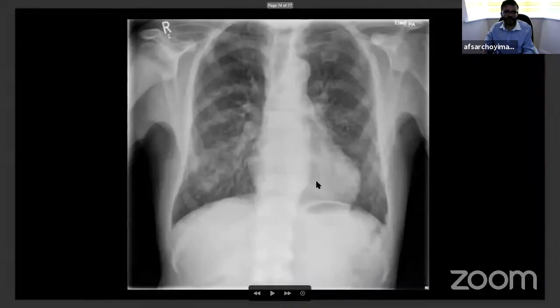So this is the last X-ray, or last 2 X-rays, and you got this patient with the fever, cough, and you got interstitial thickening there. You can see additional lines. And the key thing in this X-ray, you got the answer of what you're looking for. Pneumonia is there, but then you look at the ribs and the bones, you can see they're sclerotic. You can see sclerotic spine, sclerotic ribs, there are prostate secondaries.